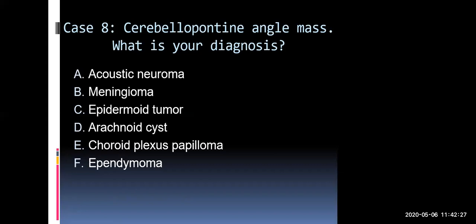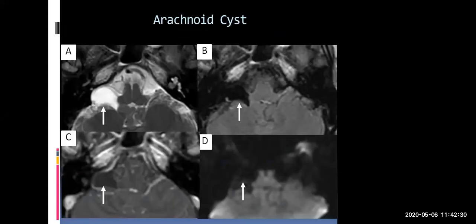What this differentiates from is its cousin, which is not a tumor at all, and it's called an arachnoid cyst. Arachnoid cysts are just loculations of the CSF. And before diffusion weighted images went around, there were patients that would actually have a craniotomy done for these because the surgeons couldn't tell for certain if they were dealing with an arachnoid cyst or an epidermoid tumor. So if the patient were very symptomatic, they would take the patient to the operating room. And you still see those patients once in a while in your practice these days for follow-up and had a craniotomy for an arachnoid cyst.